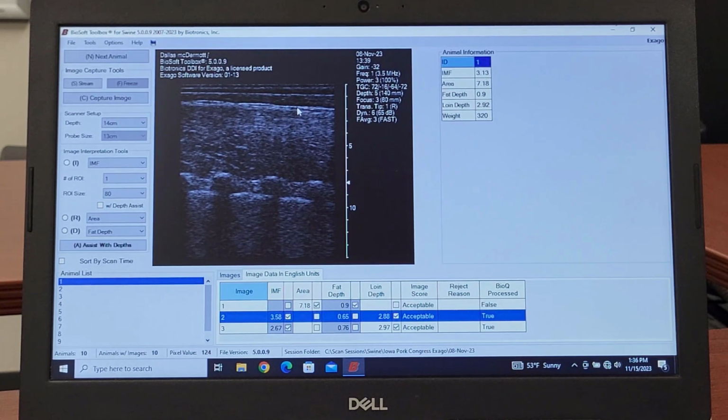These are not manually captured images. This came from a stream of images. It pulled images off of that buffer, and we are taking multiple images and processing all of those, putting them through a post-filter process, eliminating those that are outside of a specific standard deviation that are not used in the average, and then the averages are printed here. So the technician gets a shoot side feedback of whether the scan was successful and the lines look appropriate.